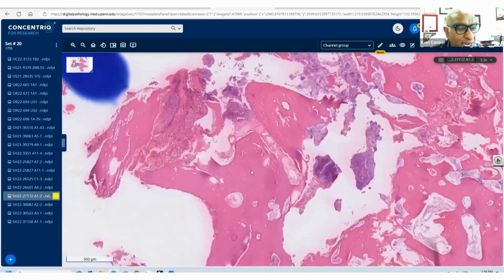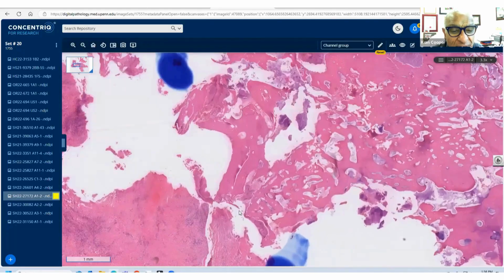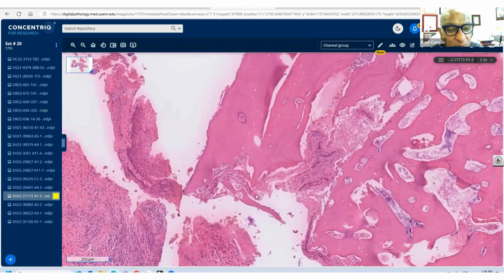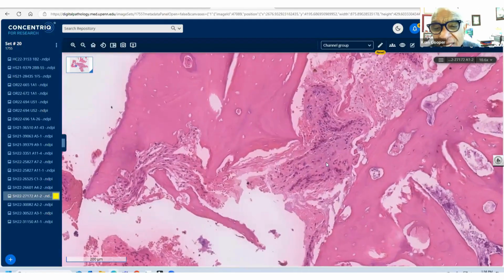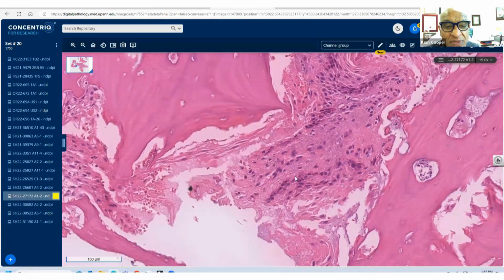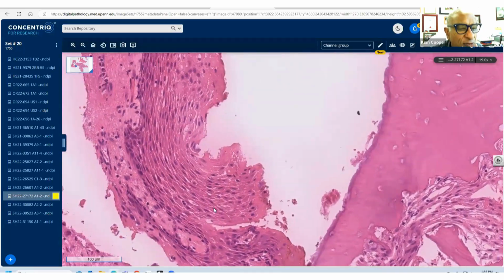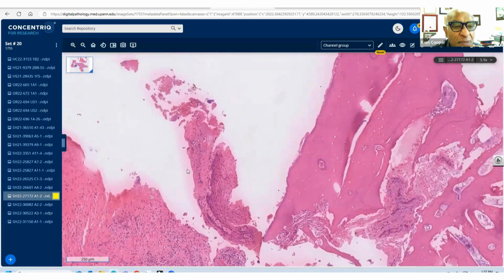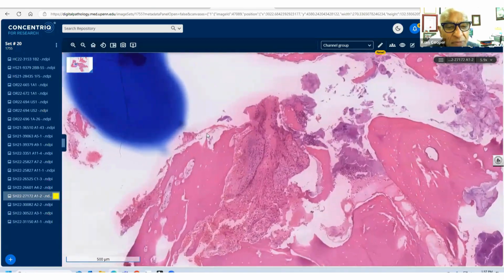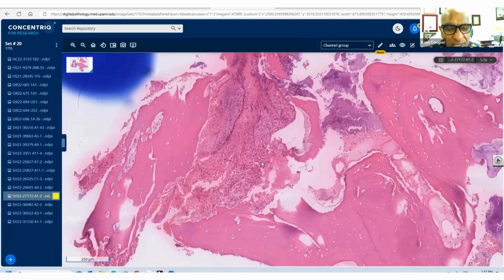So there's acute osteomyelitis, but there's something else as well. And here's my big blue dots here. Ahmed and I were talking about this past week with Casey, our medical student who joined us here. In between the bone, you can see some squamous epithelium, right? Here again, this is not a detached float. This is part of the dead bone. Let me just back up a little bit. Here you go. You can see the squamous epithelium here, insinuated between the bone.